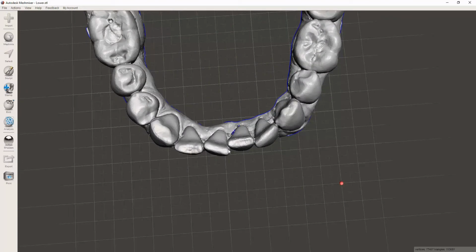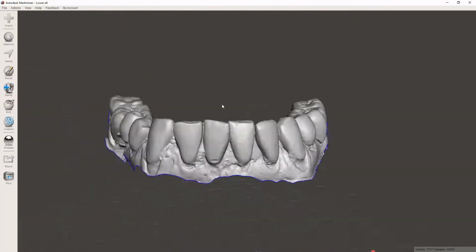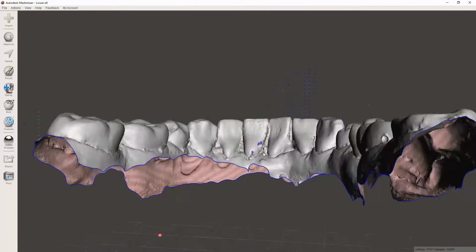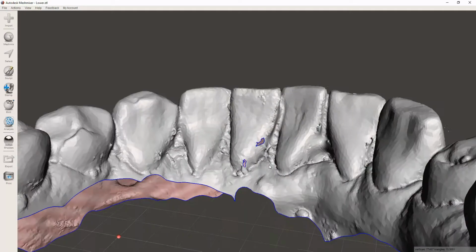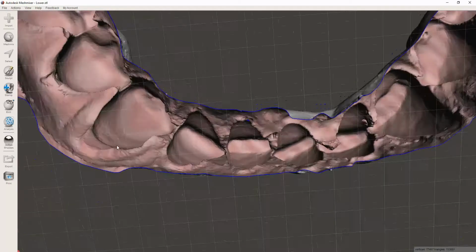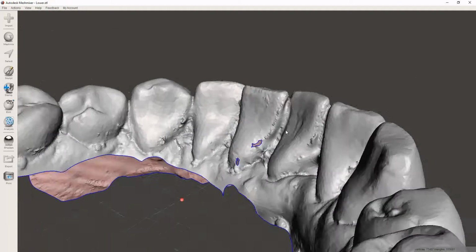on some incisors. So, first and foremost, we want to make sure that we're starting off with a really good model. And you can go through and inspect it all you want, but the truth of the matter is you may have holes that you don't even see or flaws. And also, a lot of times when you import it, it's hollow. So we want to go ahead and seal everything off, make it a watertight model, as they say.